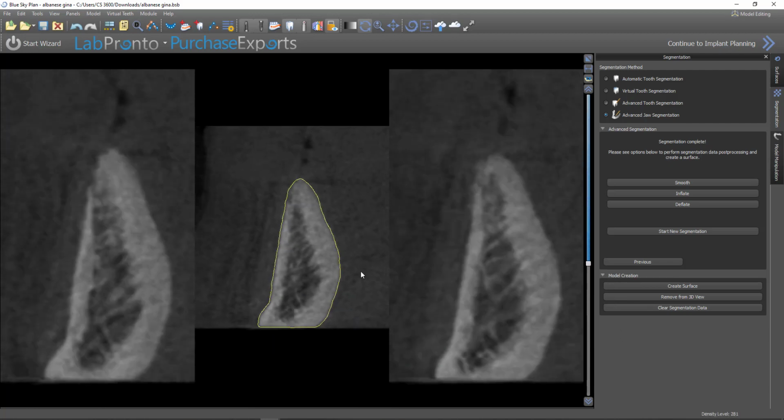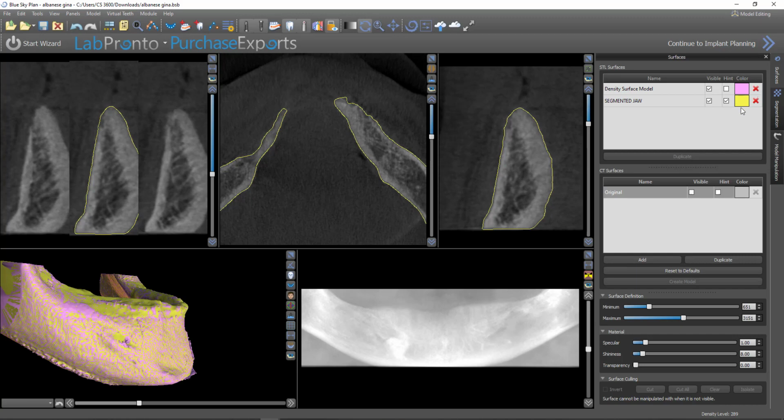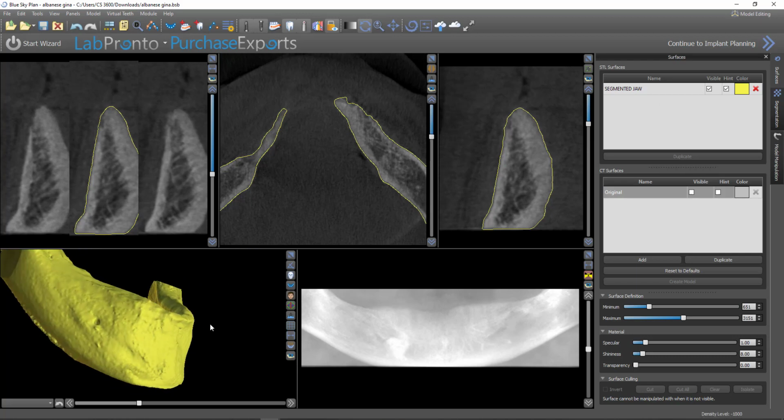So this is great. We're done with the segmentation, and now you can go ahead and do whatever you want with it. You can get rid of these other two, frankly, because now you've got one perfectly segmented jaw. So those others are contributing nothing. You've got them hopefully in some of your other files. I usually keep a file on a case I'm working with of just miscellaneous stuff that, you know, maybe I don't want it in the case anymore, but I'd like to have it. If I need to redo something, I'll throw stuff like that in there. So that's basically it for this case.